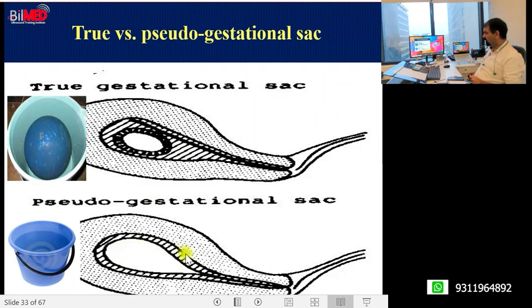But if the unobliterated uterine cavity is absent, it means that water is getting filled, merged with the walls of this bucket. So I will be having no unobliterated uterine cavity over here. Now, here we need a strong understanding of unobliterated uterine cavity.